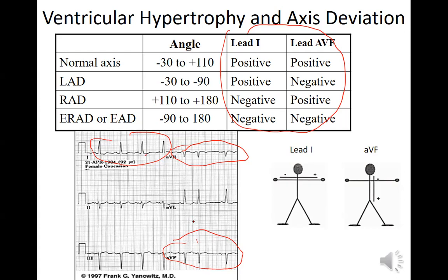But it's like the P waves are positive. No, we're not. We're looking at QRS. We're not looking at any atrial stuff at all today. Yeah, that's a great question. But we're just looking at QRSs here. Next time when we do arrhythmias, we're going to look at the mean P vector, a cute little vector in the atrium. But we're not talking about that now. We're just looking at QRS. That's okay. That's how we learn.